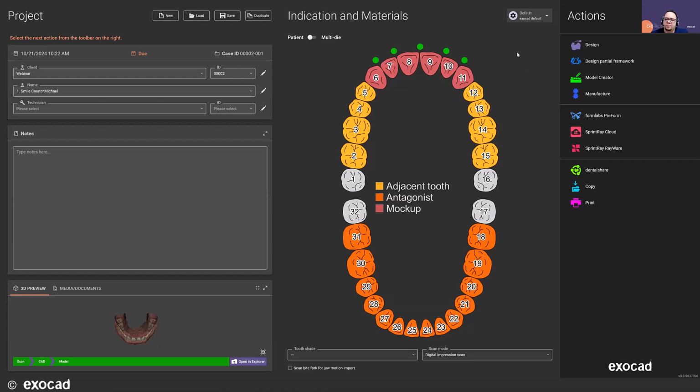You're going to have the PDF you can provide to the patient so they can show their family and friends. Our second option would be to actually 3D print your design so the patient can wear it and physically see themselves with their new smile. And then alternatively, you have a third option to generate a presentation wax-up model. From there, dentists can utilize that for creating a matrix to use flowable composite as an example, or have that presentation model to physically view the changes being made.